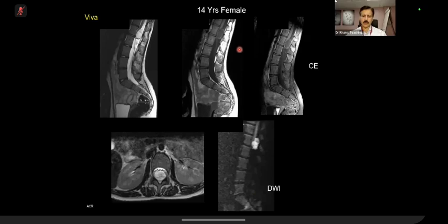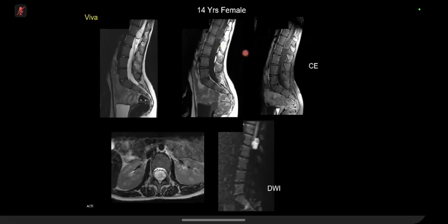Can I stop you? Yep. If you see carefully on this pre-contrast, this rim is similar to this rim. Actually, it is not enhancing. So I can do this. Thank you. So it could be a hemosiderin kind of. And on axial.